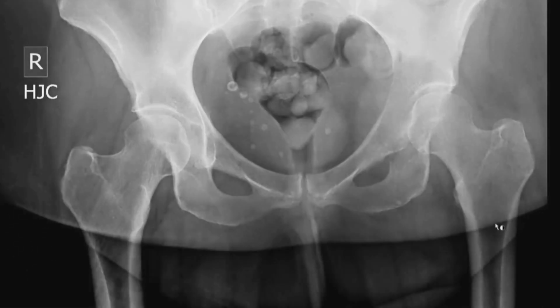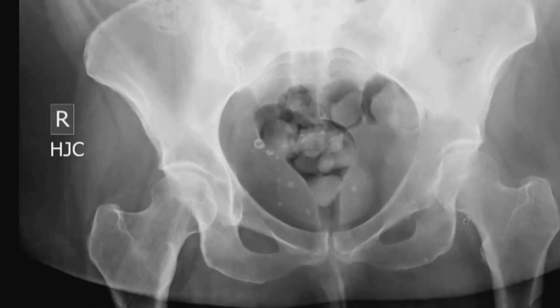There's also a lesion in the peritrochanteric region of the femur on the left, which is very subtle. I did not take off any points if this was not described in the sim because it is very subtle. A CT should be recommended to further characterize this tumor and potentially plan for surgery. The referring physician or provider should be notified directly. This would be given an acuity ranking of urgent.